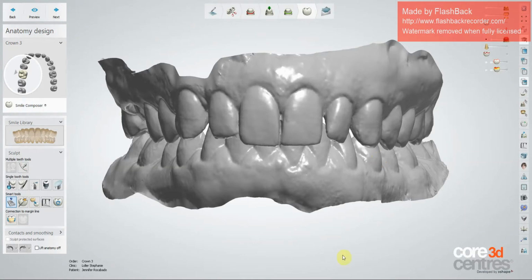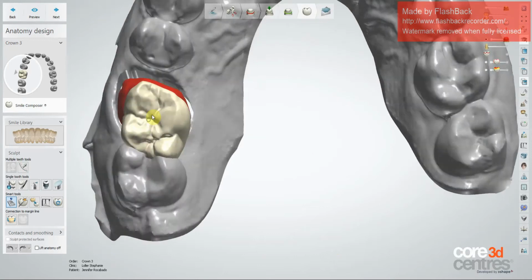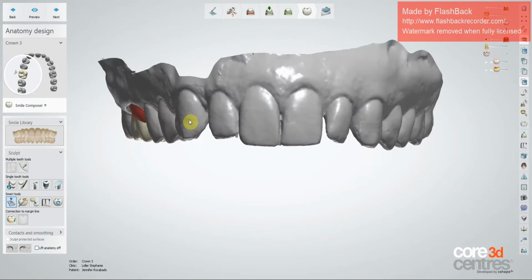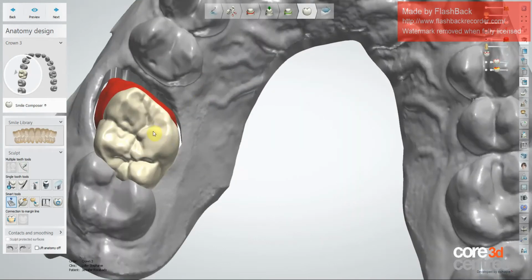My philosophy is this: leave the library alone. It's a pretty good tooth to begin with, so once you find a library you like working with, use it. With Williams, we give them this one. But the point is, you find one that's already preset ahead of time, idealized exactly the way you want it, and just use it instead of having to redesign the tooth every time. Perfected ahead of time in the library settings, and then you tweak a few things and call it good.